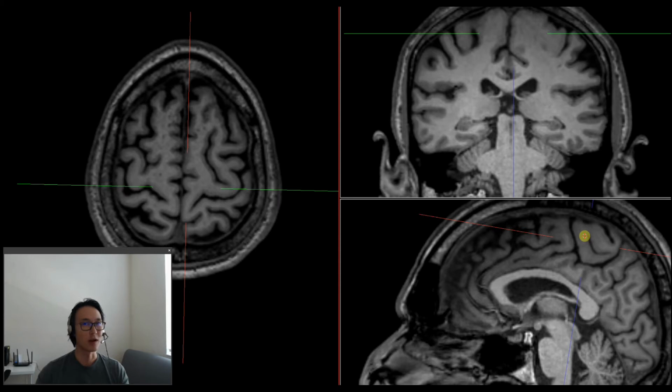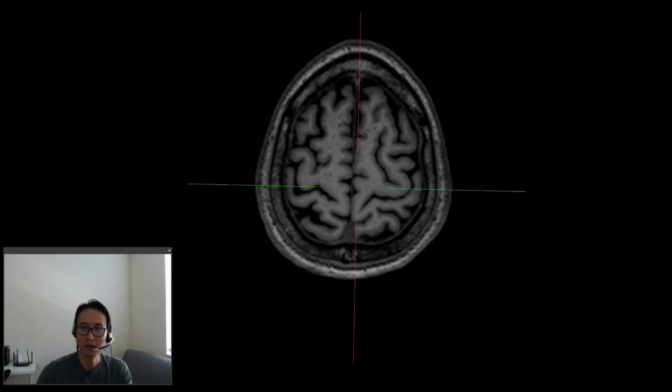All those tips were described by Dr. Thomas Naidich, and to localize those tips, we're going to use an axial view. An axial view near the top of the head. Okay, so that red line represents the level of the axial view that we're looking at. So let me zoom in. Let me use another tool.